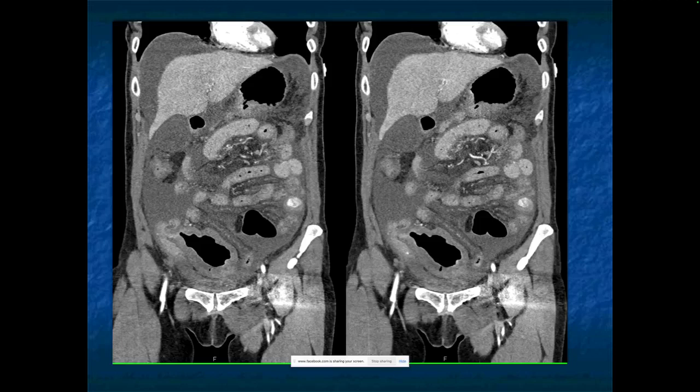Could it be inflammatory bowel disease? Could it be a bad case of Crohn's or other infectious etiology? I guess you would have to think of that, but the bulkiness of this kind of pushes me away from that. I'm not thinking isolated area of bowel so thick. In fact, if this was Crohn's, it would be Crohn's with malignancy, like an adenocarcinoma. Other things you get, terminal ileum into cecum, you got to think about lymphoma. Again, if patients had organ transplants, PTLD would be a good thought.